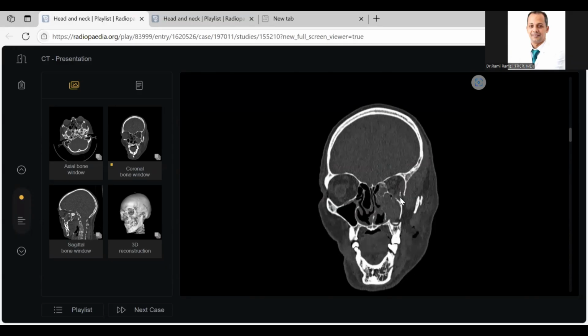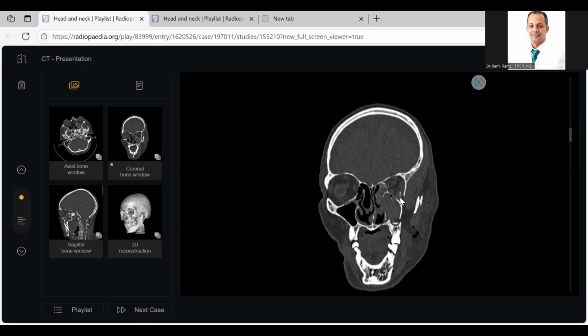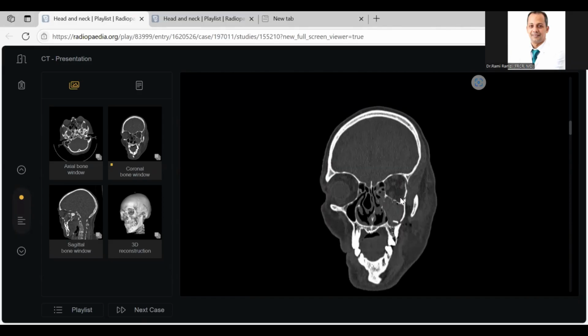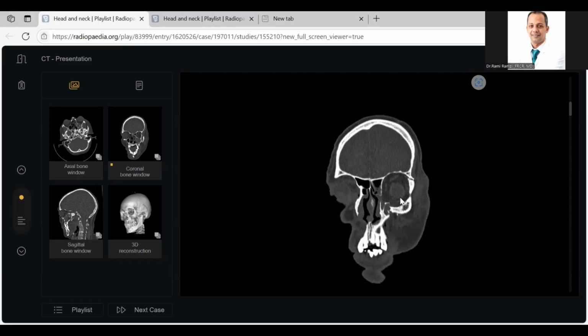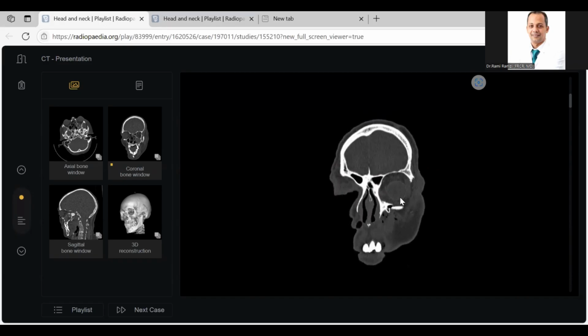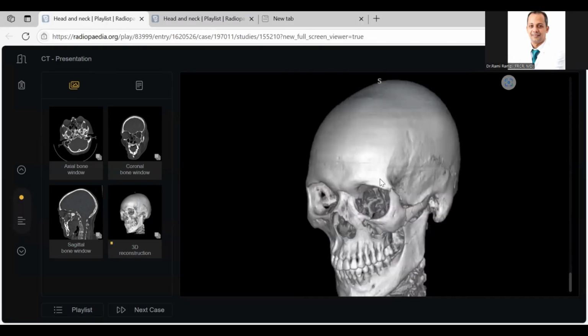I will check if there is any herniation of orbital contents. I think there is herniation of orbital contents here. So with a trapdoor appearance, I will immediately contact the referring physician or the trauma team for immediate management of this patient. Thank you, doctor, so much.